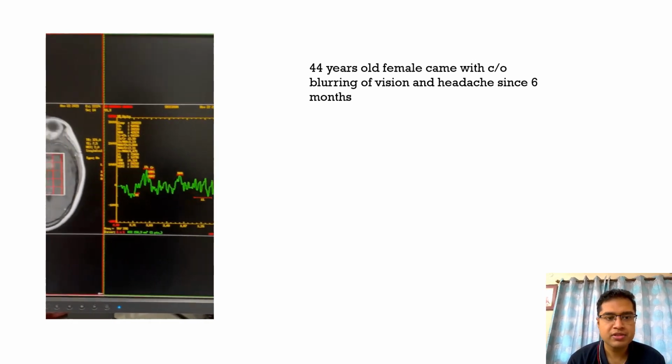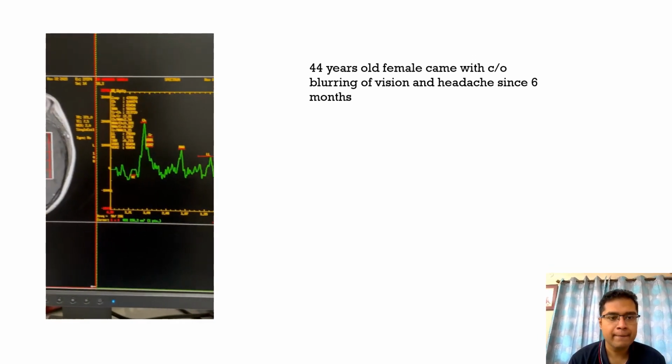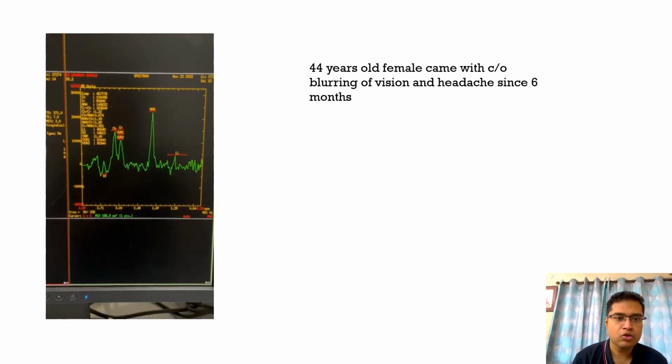These are the MRS images where we can see that within the lesion there is a choline peak and reduced NAA and a lipid lactate peak at some places, suggesting areas of necrosis within the tumor.